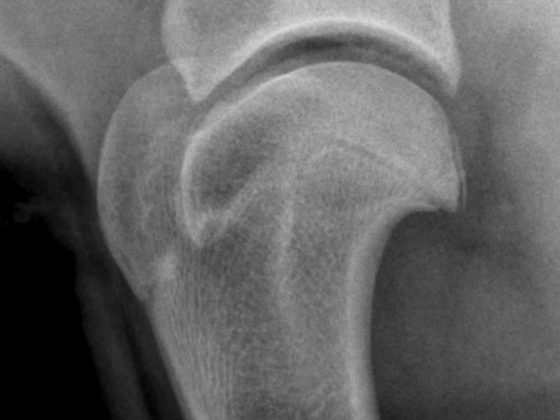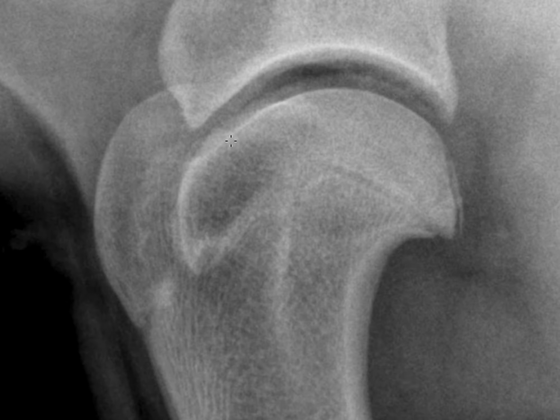If you look very carefully, you will notice this very thin and well-defined mineral opacity, which represents the subchondral bone of the humeral head. And as you follow this caudally, you will realize that from this point onwards, the line starts to fade away, and the humeral head, instead of being rounded, is slightly flattened. So we do have a defect in the area.